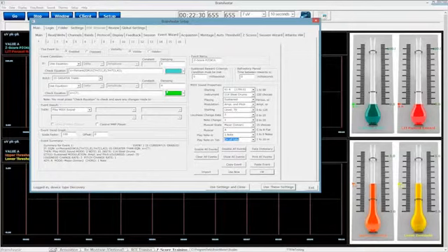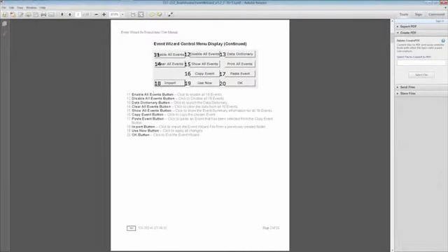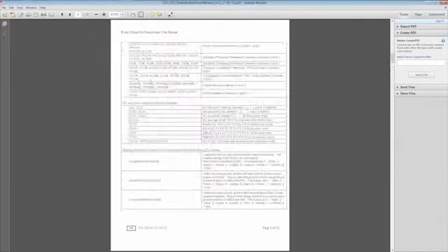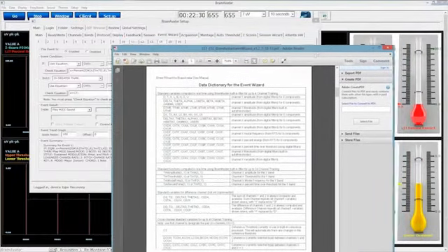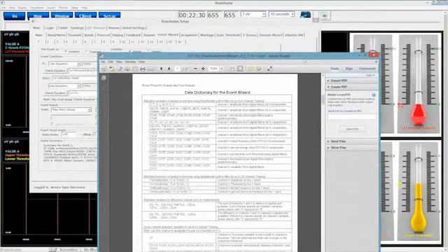One of the new features in the software is going to be right here, and you're going to notice it on the first page of the data dictionary for the Event Wizard. You have standard variables computed in real time, up to 4 channels. Now you have this one right here called standard functions computed in real time using BrainMaster built-in filter for up to 24 channels. That is a large change. So now we have these new, as we call them, functions that are built in that give you a longer range of getting at more training channels.